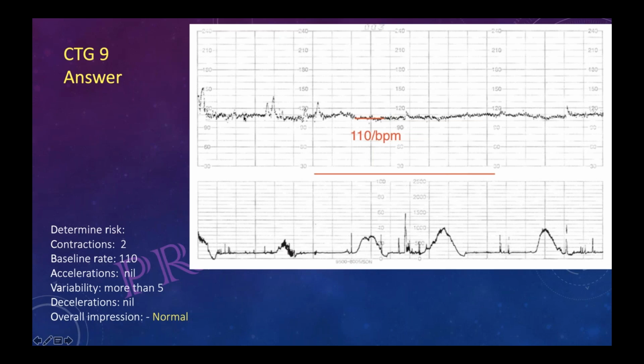Here it is 30, 40, 50, so this is 10, but if you draw one line here and one line here, it will be more than half a box, so it is more than 5. Is it clear? What I was looking at was more on the right side, after the contraction. That was looking less than 5 to me.